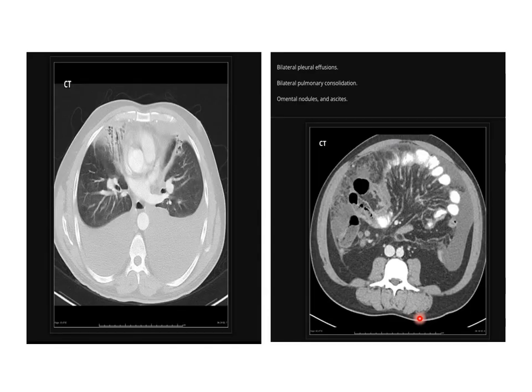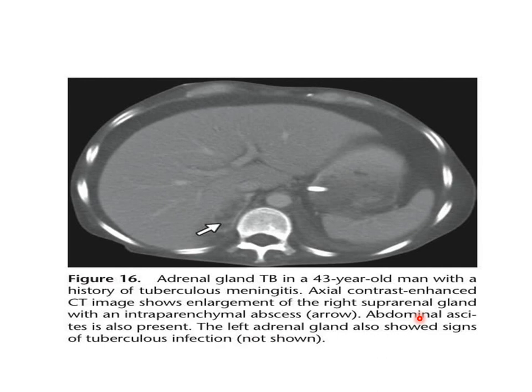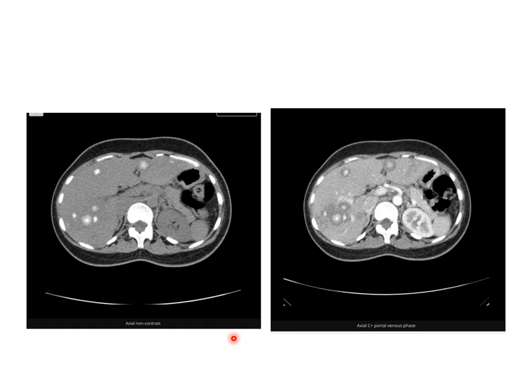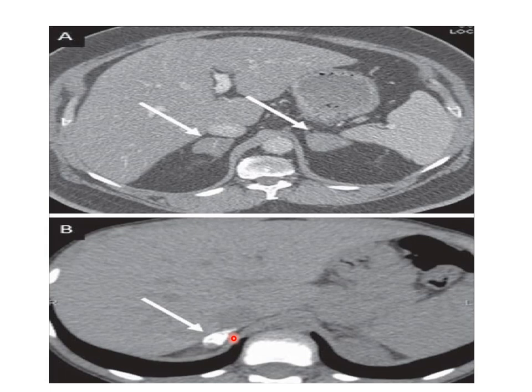This is adrenal. We have solid organ involvement, the adrenal gland. It causes a mass-like lesion with necrosis inside. It's usually bilateral, and at the end stage, it will be calcified. And this will cause adrenal insufficiency, right? Yes. At the end, they have adrenal insufficiency.